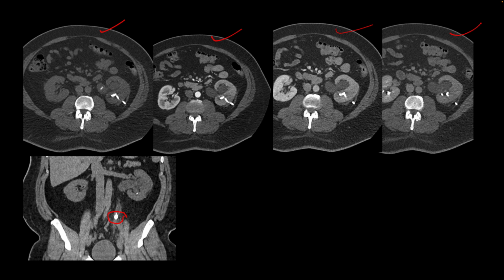And we find on the non-contrast enhanced image that they have a percutaneous nephrostomy catheter, but as we go through the contrast enhanced images, we find that there is hypoenhancement of the left kidney compared to the right, suggesting that they are still obstructed. And then we see this dilated collecting system suggesting hydronephrosis. And so that means that this percutaneous nephrostomy catheter is not working, and it should be reevaluated and probably exchanged.